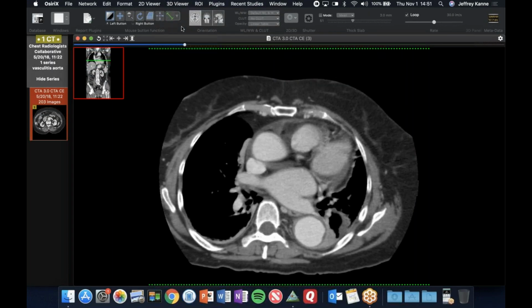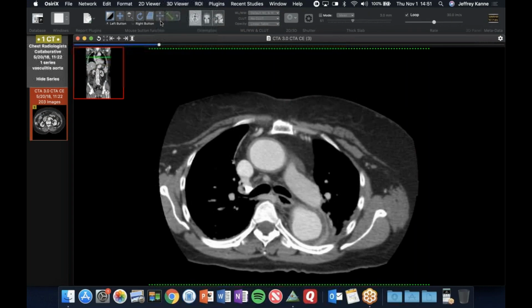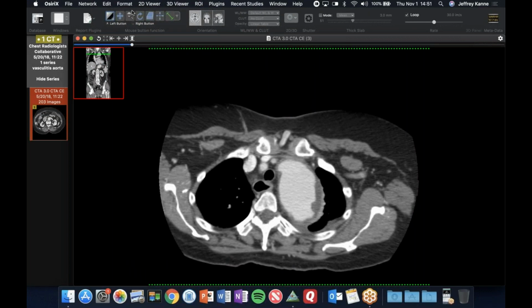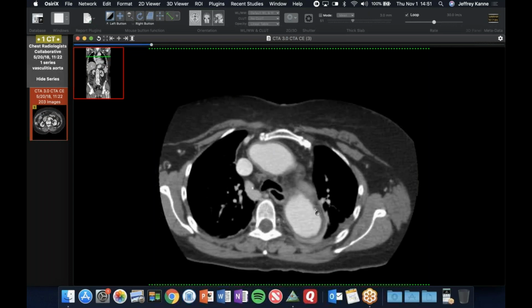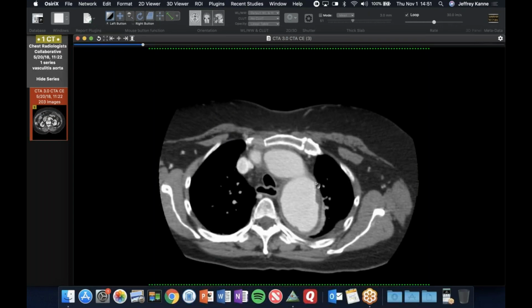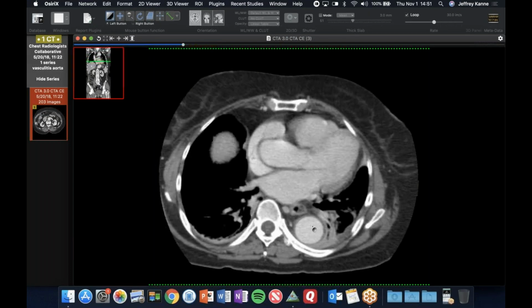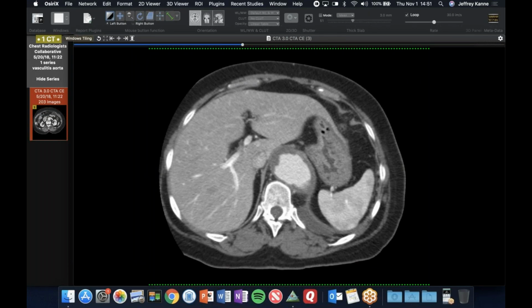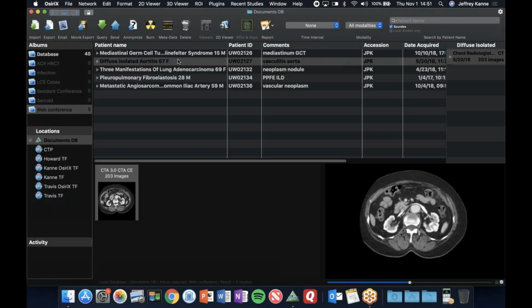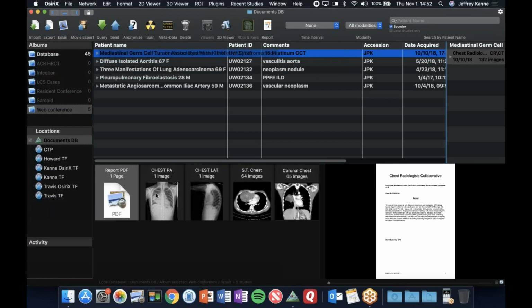But it would be very easy, especially for someone less experienced, to just chalk this all up to atherosclerosis, because you clearly do have this plaque. Interesting, she doesn't have a lot of calcified plaque, so I don't know how much of this is secondary, but some of this must be atherosclerotic plaque, but most of it I think is all aortitis. So she may get follow-up imaging. I don't know. All right, this is kind of a cool case.